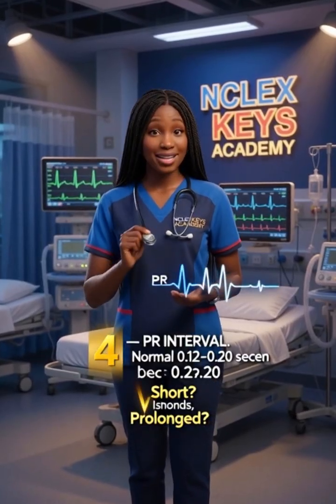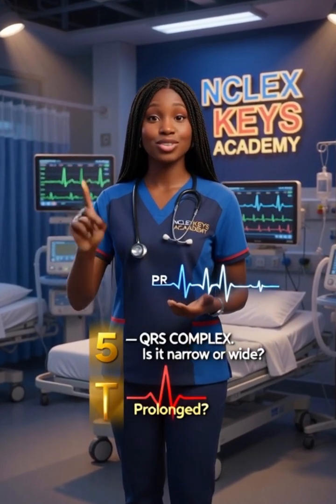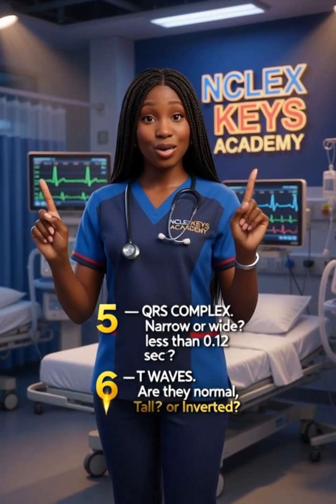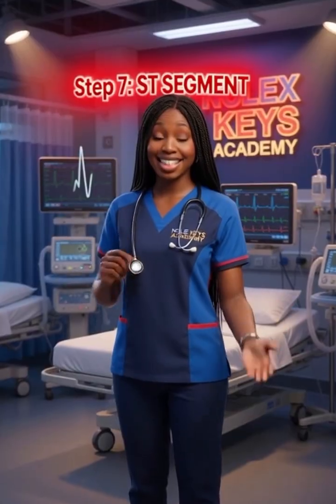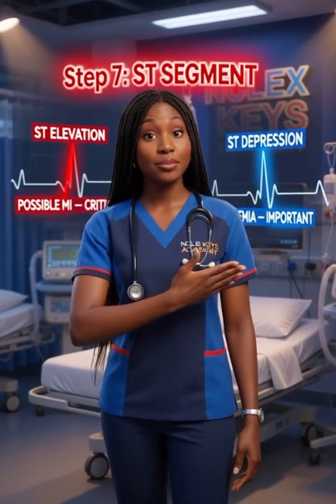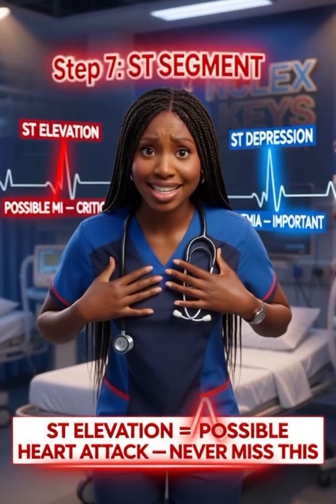Step 4, PR interval. Is it normal, between 0.12 and 0.20 seconds, short or prolonged? Step 6, T waves. Are they normal, tall, or inverted? Step 7, ST segment. Is there ST elevation or ST depression? ST elevation may indicate myocardial infarction, a heart attack. This is extremely important on your NCLEX exam.